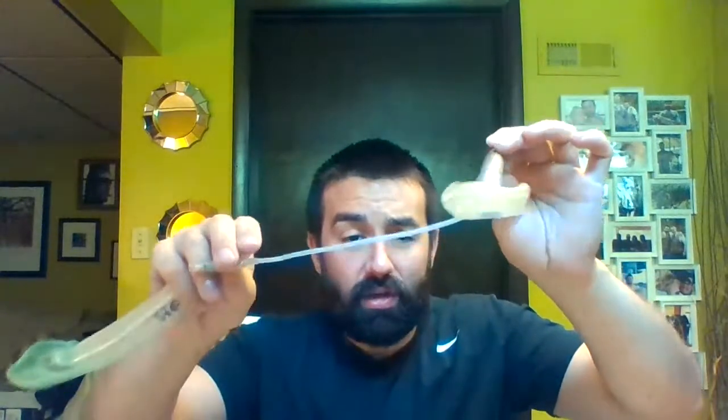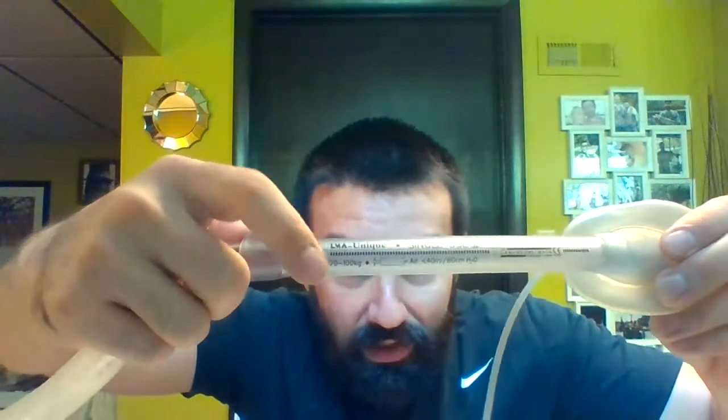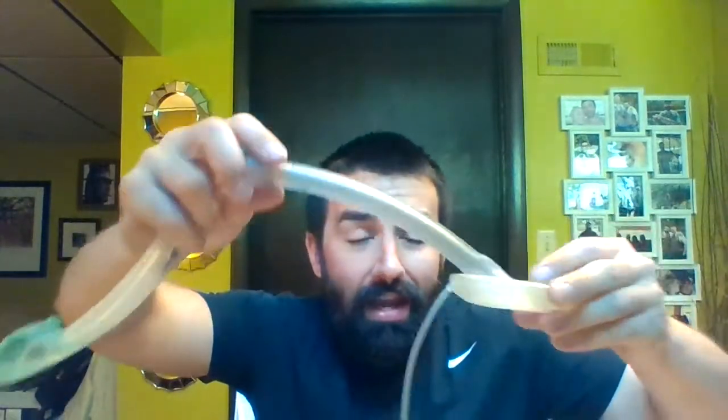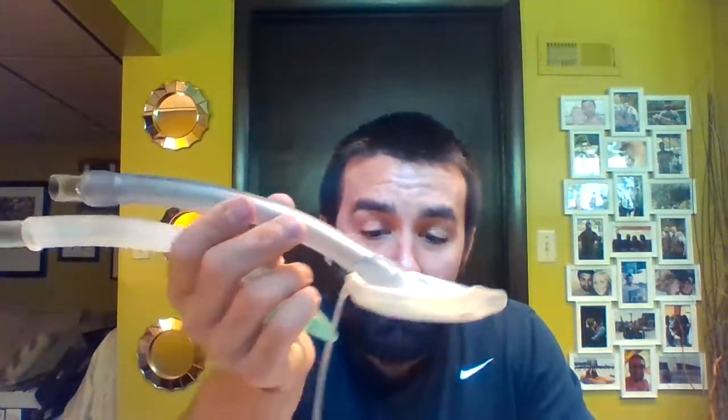You usually need at least a 30 cc syringe for these. And there are different sizes, 3, 4, and 5. And it's all weight-based here. So it'll tell you what size, and this is actual body weight, okay? It's not an exact thing, but it gives you general guidelines. The larger the number, the bigger the tube, obviously. Essentially, this tip sits in the esophagus, and this masks the airway itself. And hopefully the epiglottis is kind of pulled forward and everything.